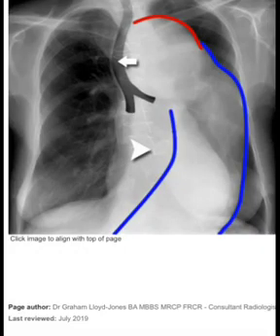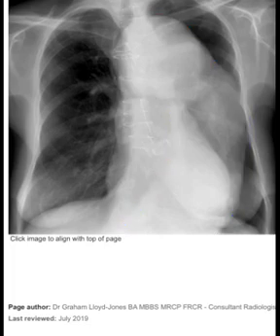Thoracic aortic aneurysm, sternal wires and aortic valve prosthesis, arrowhead. Massive aortic knuckle, red line, displaced trachea, arrow, and widened tortuous descending aorta. Clinical information: history of uncontrolled hypertension, previous history of severe chest pain radiating to the neck and back, chronic thoracic aortic aneurysm treated with surgical repair of the aortic root.